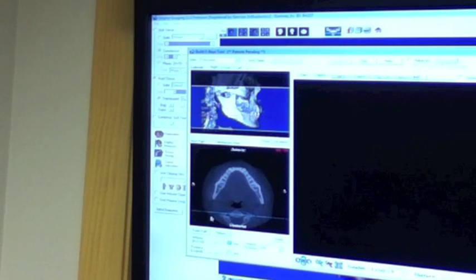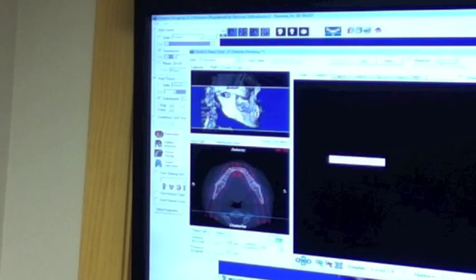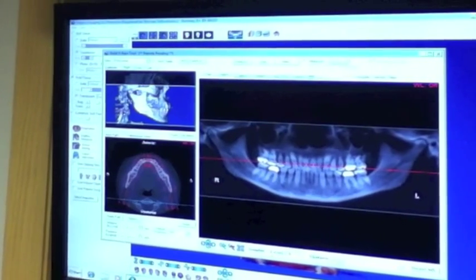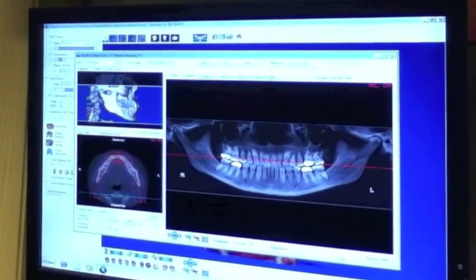Start with your first path point behind the blue line by clicking your mouse and make clicks along the arch, keeping them in the teeth. Click all the way through and end by double clicking the last path point behind the blue line. You'll hit Apply. And then you can sharpen and adjust the Dolphin level to the doctor's preference.